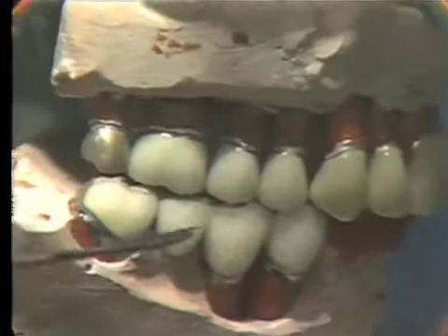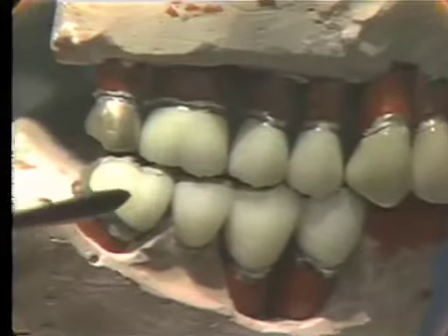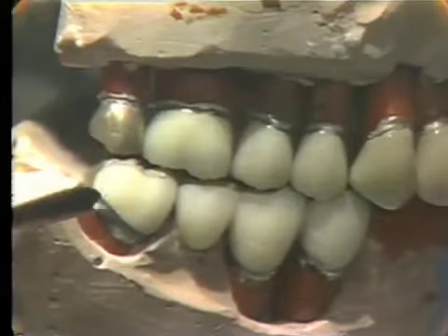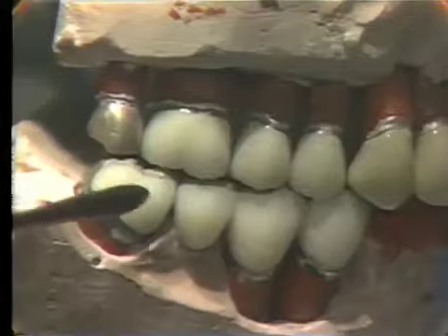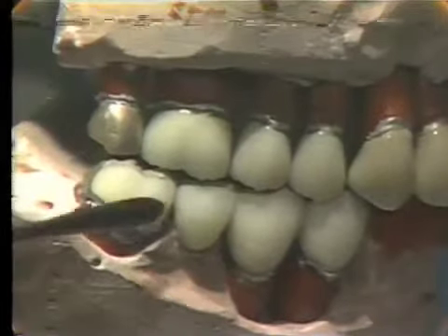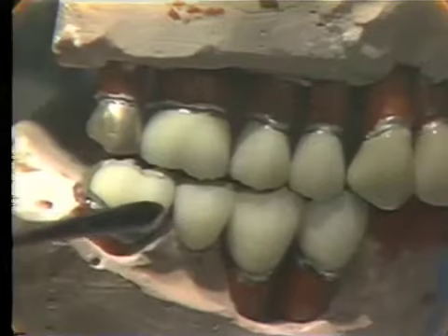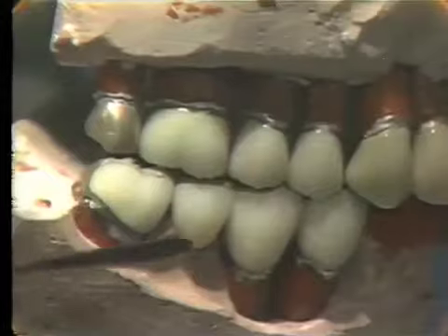This bridge, the mandibular bridge, is a unit casting. It is better to do a unit casting because if you wanted to stain or characterize this after it was glazed, you could do so because you could heat this up to melt the glaze. If you solder after you have glazed it, then you cannot characterize or stain.